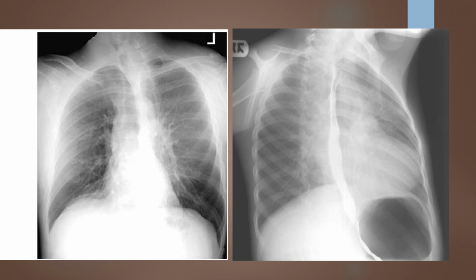And I would say that I am very limited on my penetration. There's very poor penetration through the diaphragm, very poor penetration through the mediastinum and the great vessels here. Grayscale looks acceptable, but I would definitely increase my mAs, possibly my kVp and my mAs according to what my exposure index was. But if all the legalities are there, I'm going to continue my investigation to support this. Right now I'm leaning towards repeating this exam, but I'm going to further my investigation to ensure that that's what I want to do.